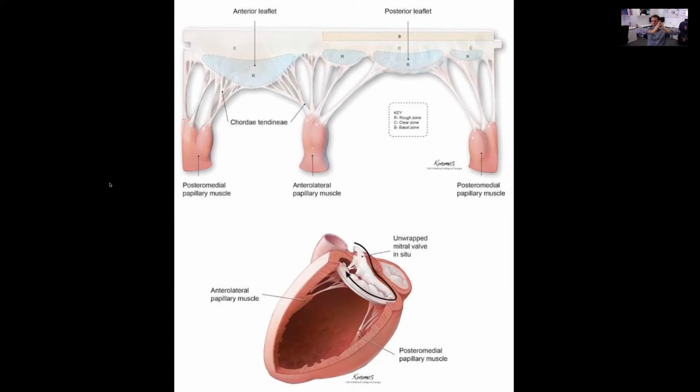But as you start to dilate, if you're getting something like functional MR that comes from either tethering or from dilatation, that area where they're coming together gets less and less. And so suddenly you're much more likely to get regurg if you've only got a little leaflet tip. So that's, again, one of the things we can look for on 2D: how much of a coaptation point we have. If you've normally got 3 to 4 millimeters, that's great, that's normal. And if you've got more like 1, you've got to be suspecting that we might get more significant regurgitation, particularly if we then fluid overload our patients like we've been known to in the ICU when we're trying to resuscitate them. And that's when you can start making regurgitation go worse.